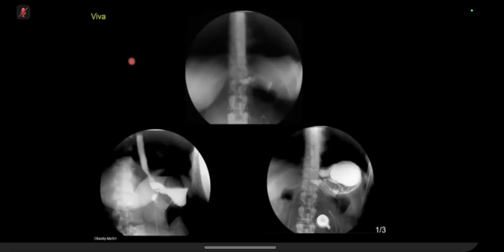It appears that the gastric band may have slipped inferiorly, with a larger portion of the gastric fundus seen above it. I'd expect the gastric band to be pointed more superiorly, towards 1 to 2 o'clock, but on the second image we can see that it's pointing more inferiorly.